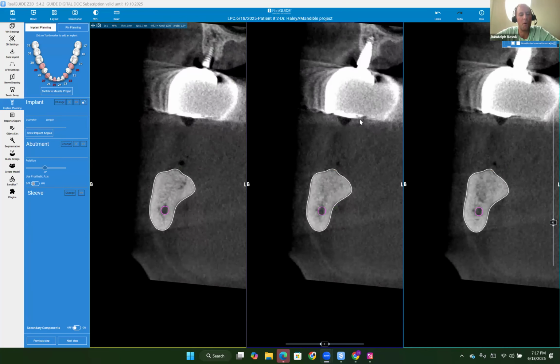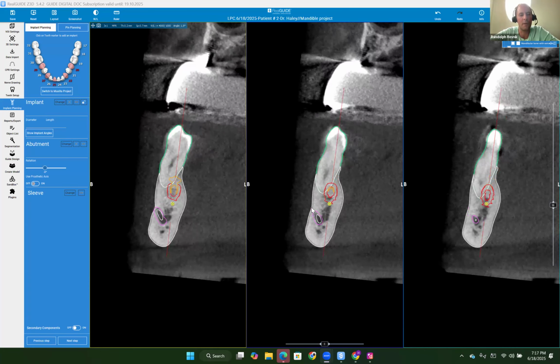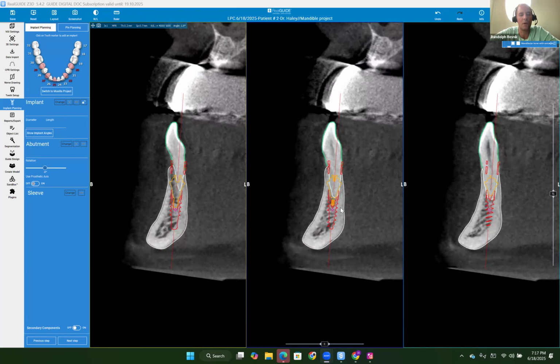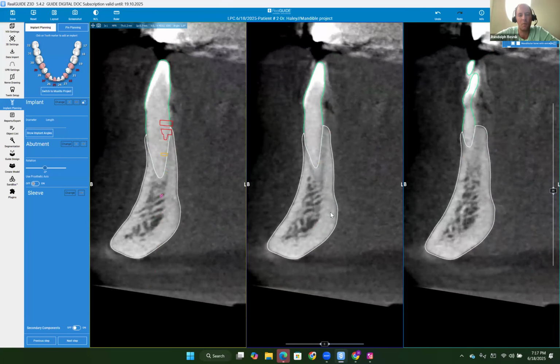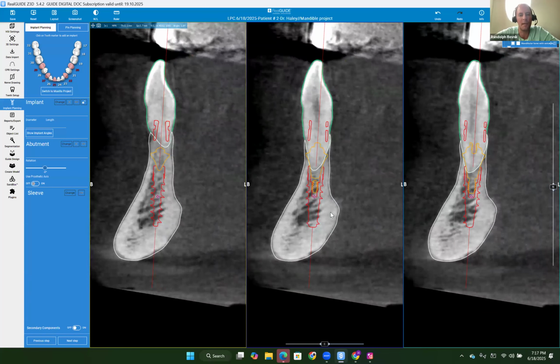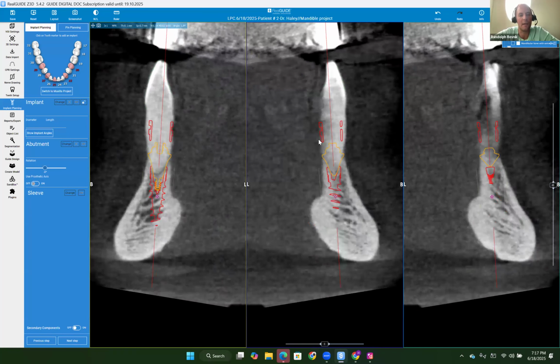In terms of the bone quality, you have great bone quality on each of these implants. You'll be engaging the cortical bone on the buccal and lingual of all of them there. So in terms of primary stability, you should have great primary stability with them. Probably your most challenging part is going to be to get these teeth out. It does look like they have pretty long roots, but fortunately, there's not really much bone around the roots, so you can do some plasty and then take the teeth out there.